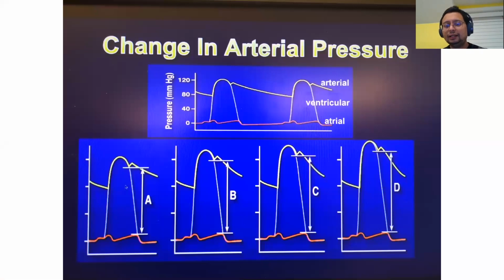So for example, let's see this patient. This is the patient initially. You can see that the pulmonary artery pressure is high. Let's say we give some medication, and the medication reduces the pulmonary artery pressure. When the medication reduces the pulmonary pressure, you can see that the IVRT is coming down as well. Not only does the pulmonary artery pressure come down, the IVRT also comes down.